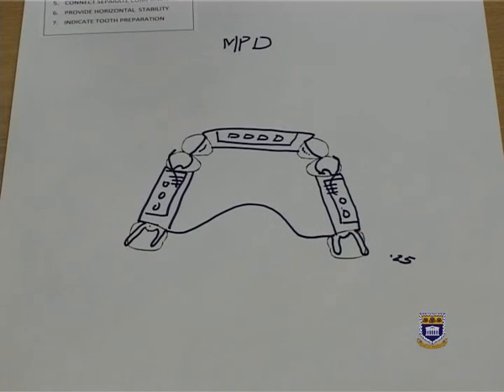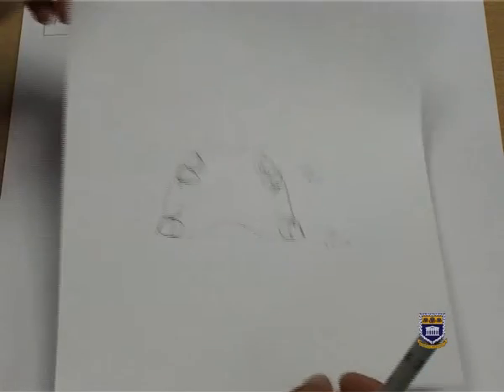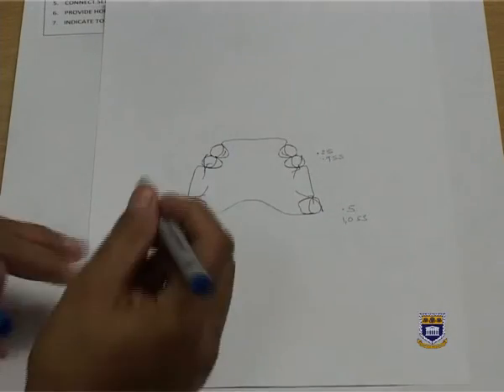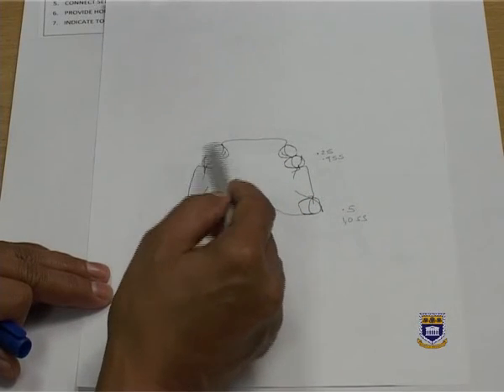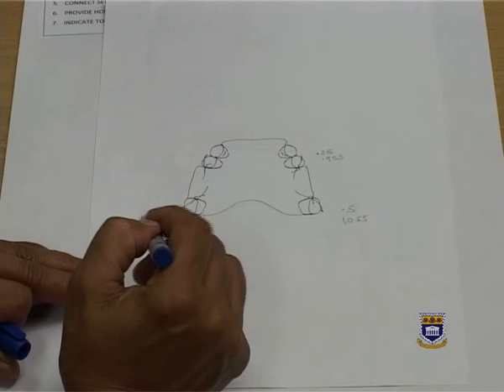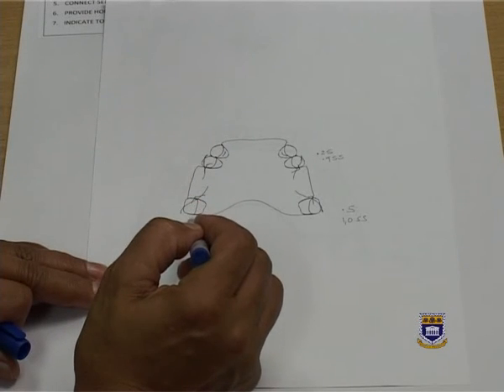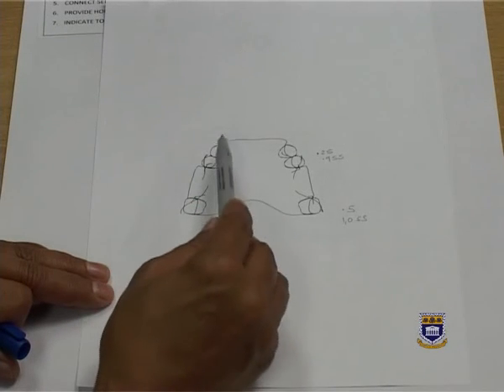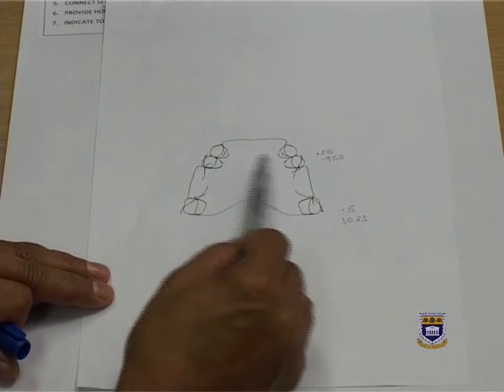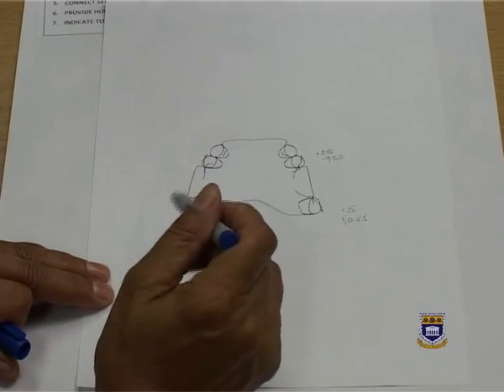If an acrylic partial denture was indicated, remember we construct acrylic partial dentures using exactly the same principles as for metal partial dentures in the designing and constructing. Here we usually have to cover more of the teeth to provide strength and rigidity for the acrylic.